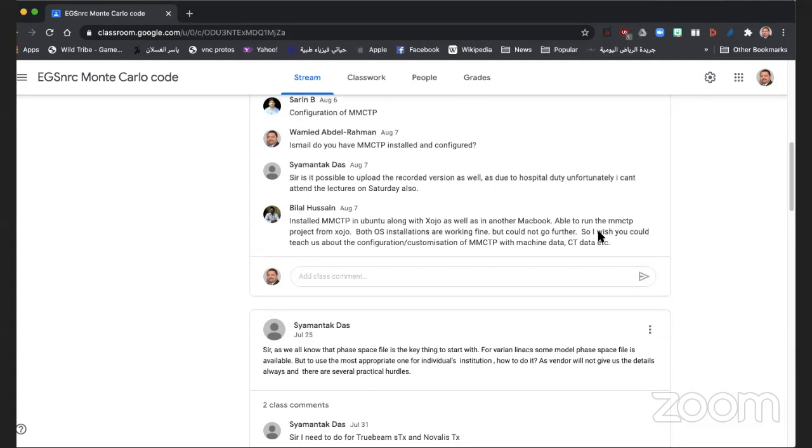So what you need to do is unmount the home directory. Then the local home directory is going to appear to you. Move the files, use FTP or whatever, to the home directory on the server, and then mount the server's home directory again on all your clients.